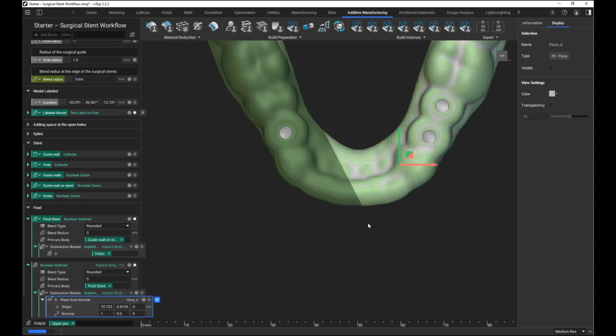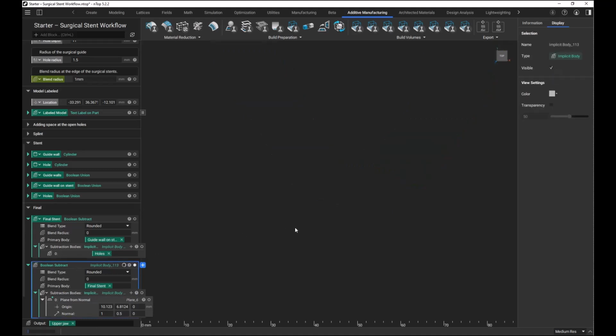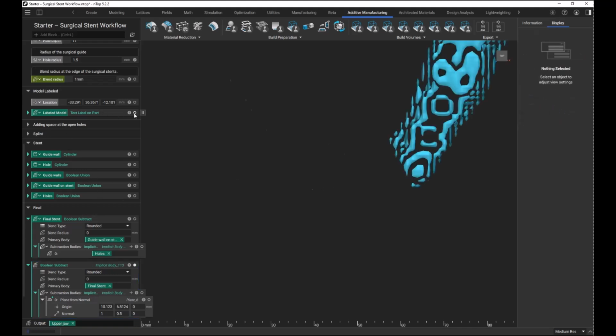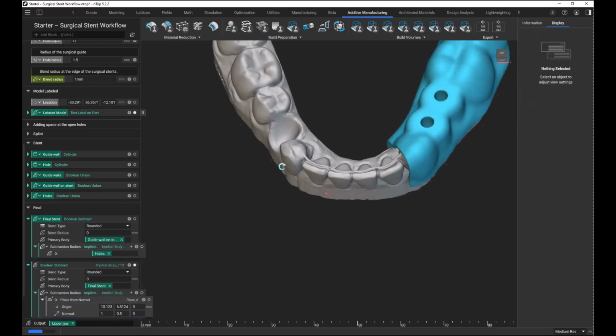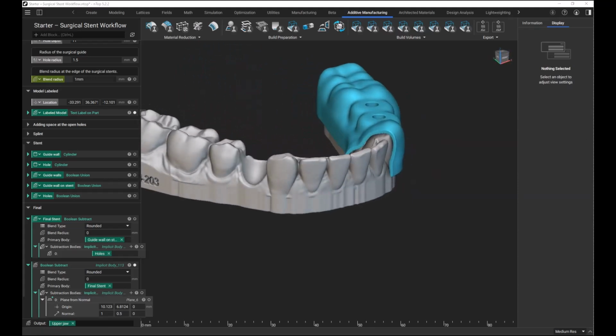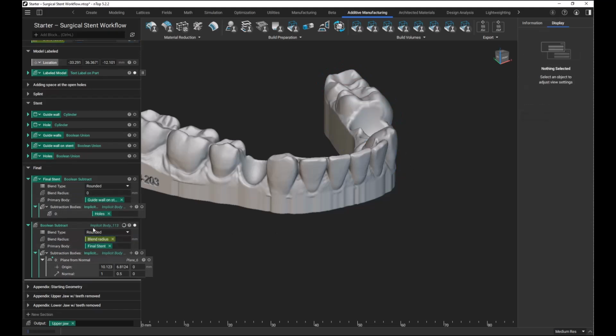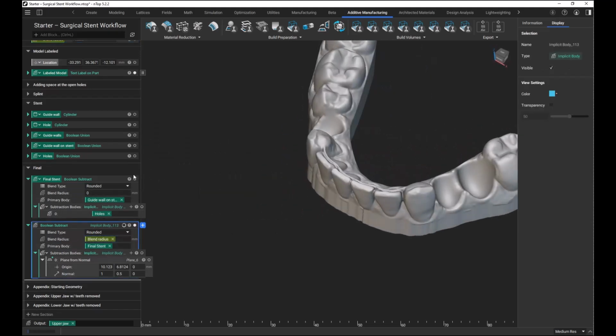You can see it's adjusting that model as I'm going through that. And I'll change the color so you can see. Where I have something more like this. And I could add a blend radius, for instance, with that 1 millimeter that I have in the inputs at the edge so it's a bit smoother. And I'll just label this our final section.